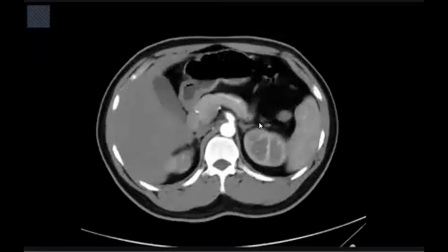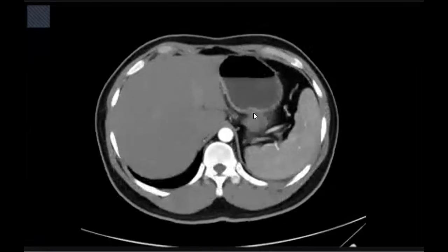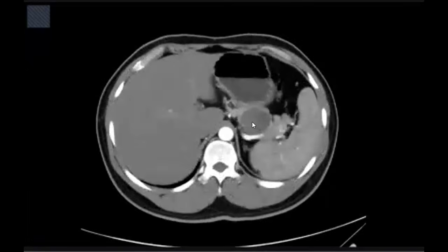Okay. Sorry, it is jumping a lot. Wait, scroll slowly, and you can appreciate that.